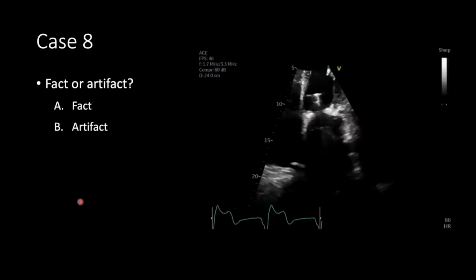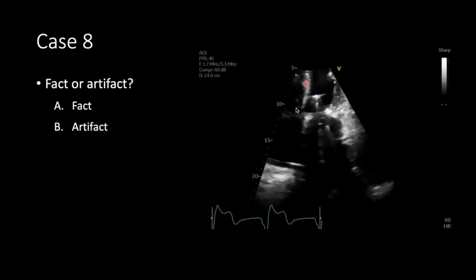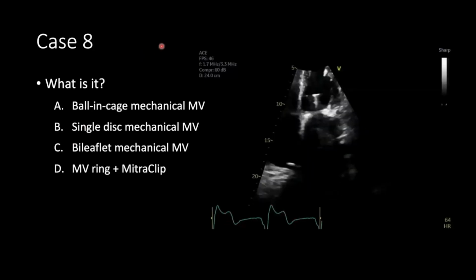So do people think this is a fact or an artifact? I'm actually just pointing at the whole structure, not at that specific line. This whole thing here. I think most people are saying it's a fact. A couple of people think it's an artifact. Okay, let's move on. Most people agree it's a fact.